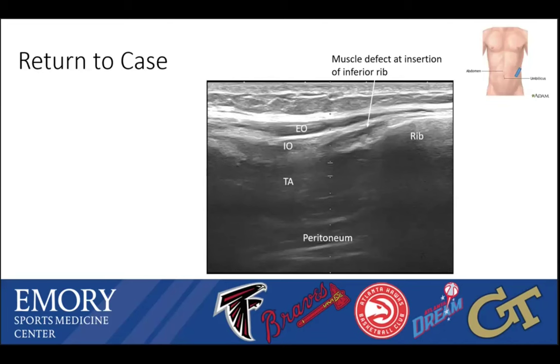You could measure the length of this defect for the report. We did not in this case, but for the full evaluation and documentation, I think that's a reasonable step to delineate the size of any muscle injury in at least 2 dimensions. And again, you can see that this is a somewhat more oblique view from what the ones we've been looking at previously were.